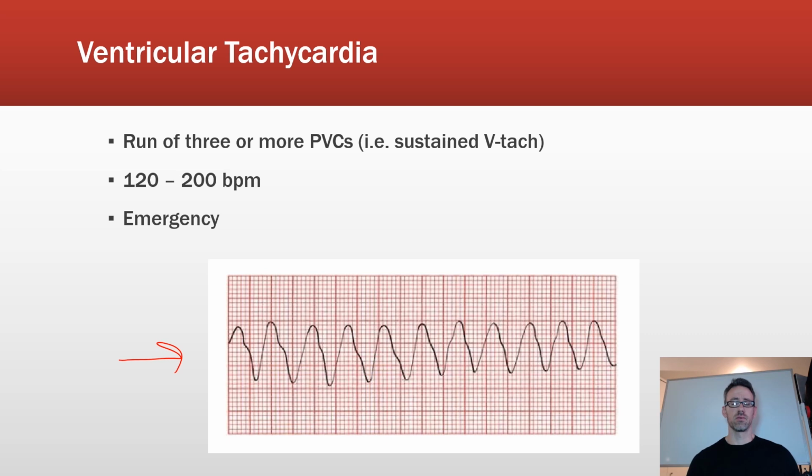And clinically, a younger patient with a PSVT would respond to a carotid massage, whereas in VTAC they would not. Plus in VTAC it could change cardiac output and stability and so on. And so there are other clues within context that could help us discern the two.